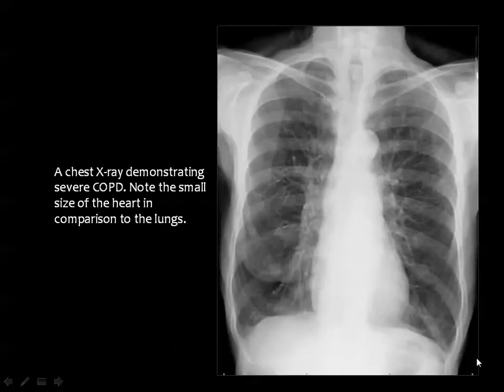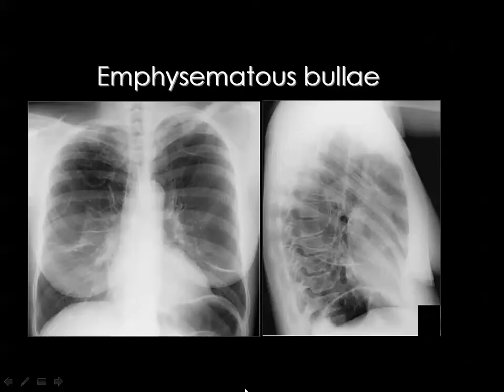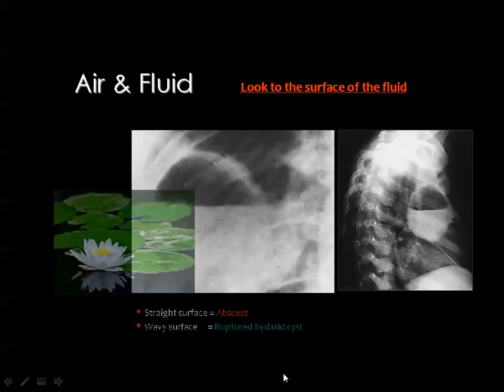of the right lung. And this is what we call chronic obstructive pulmonary airway disease with hyperinflated chest, low flat diaphragm, ribbon-shaped heart, enlargement of the hilar shadows, and peripheral attenuation of the vascular markings, and I will discuss this in full detail in the topic of diffuse lung disease. Then this chronic obstructive airway disease may be associated with emphysematous bullae or not. And you see here gross multiple emphysematous bullae in both lung fields, both in the lateral and the frontal view.